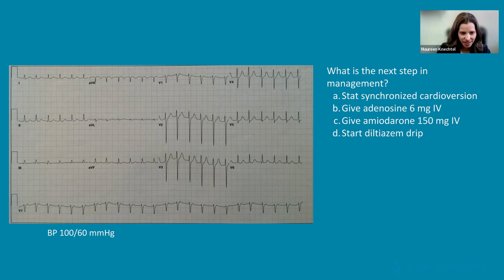Okay, so let's take a look here. Here's the EKG again. What would you do? What is the next step in the management of this patient based on the whole picture?